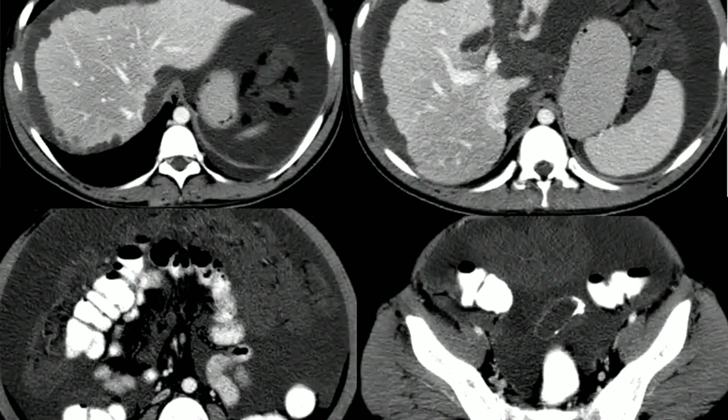I'm provided with axial slice CT scan, abdomen with contrast study, with venous phases and also a barium study. I can see there is abdominal pelvic ascites noted, and there is also irregularity of the liver margins.